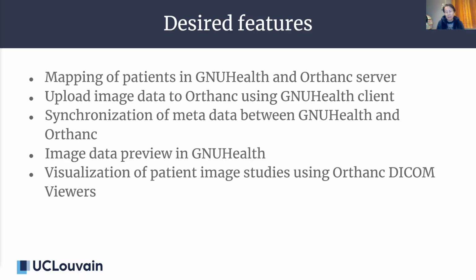Based on the requirements or challenges, the desired features for the integration are mapping patients in GNUHealth and in the Orthanc server. The mapping means that we have to find the relation between patients in the GNUHealth patient list and the patient names used by the image data on the PACS server.